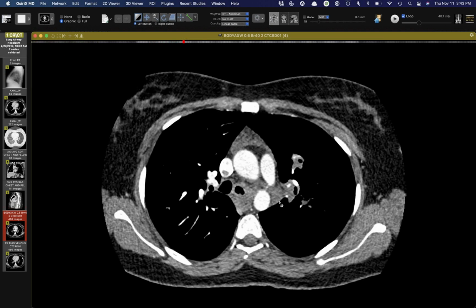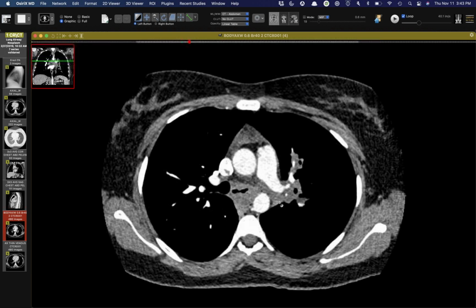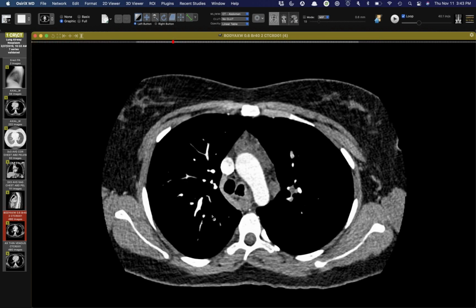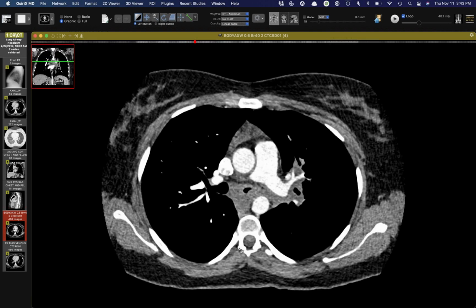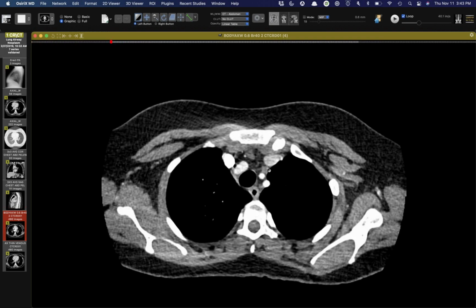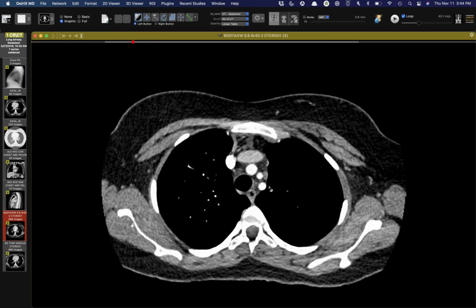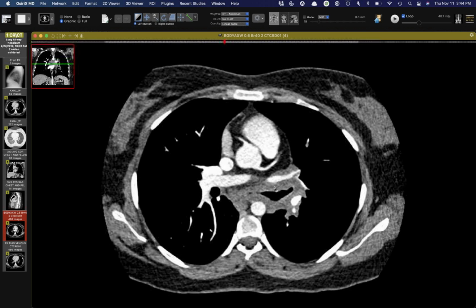You're getting warm. What do you think? I'm wondering about Kaposi sarcoma. Well, this has been going on for a couple years, and there are skin lesions with this disease. It's not HIV and Kaposi sarcoma. Okay. And the hint is that we see this sometimes, that this is a neurofibroma. Oh. Probably, I would guess this is of her vagus nerve.